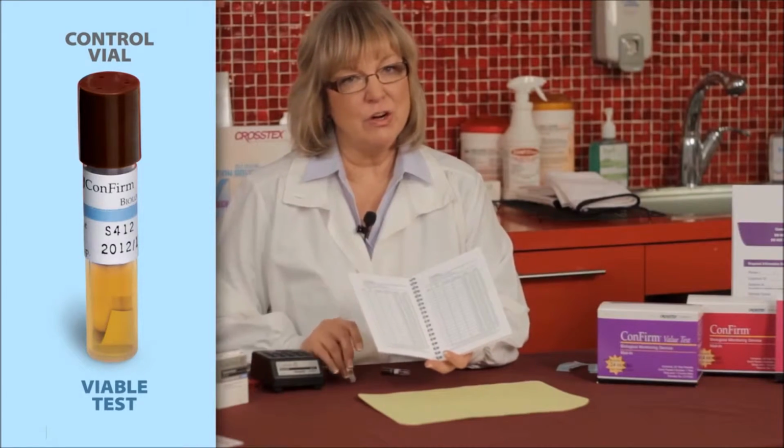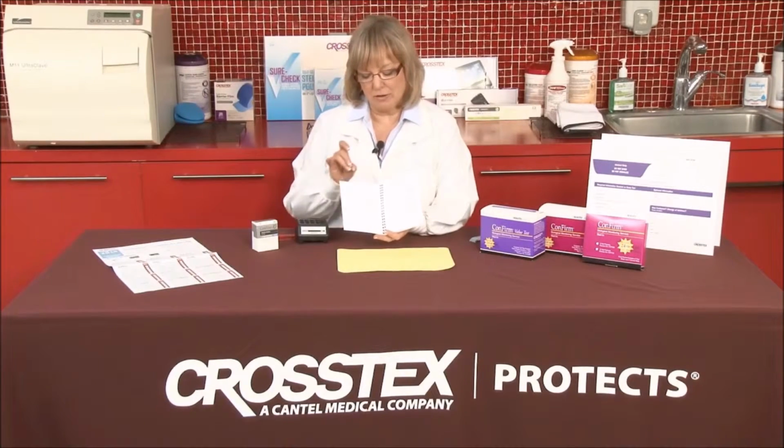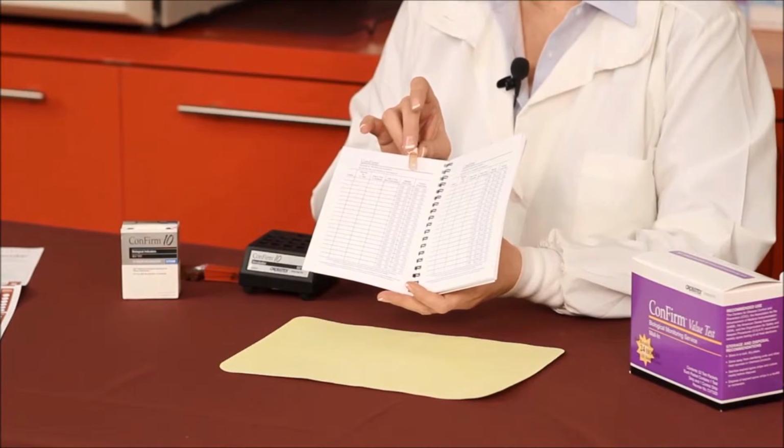Now let's change the scenario a little bit. What if when I took my test vial out of the incubator and it had changed color? It had gone from purple to yellow. That would indicate that this test has in fact failed.